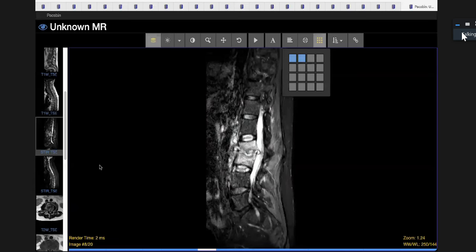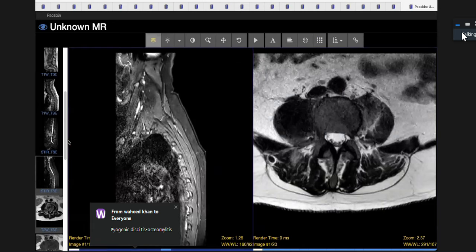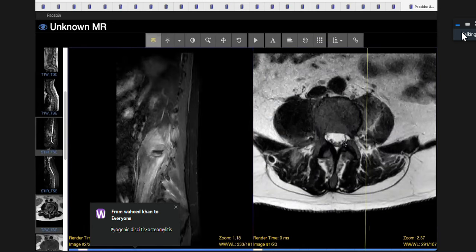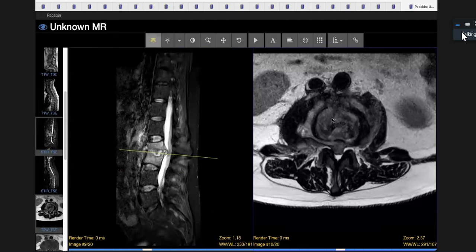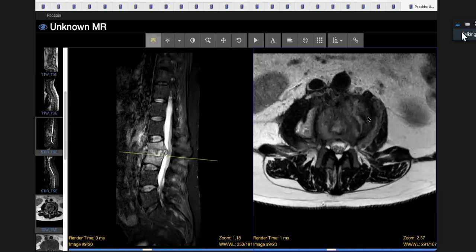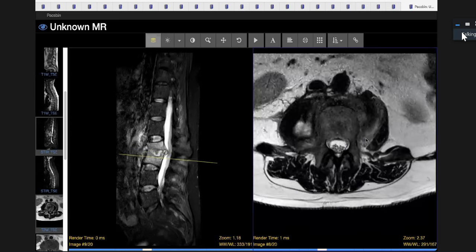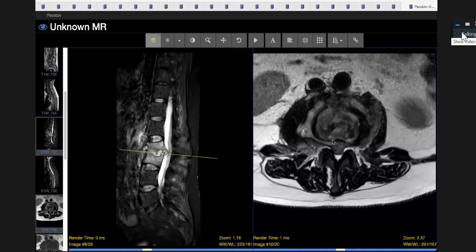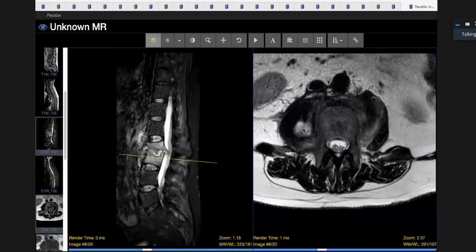That's okay. Yeah, go for it. So yes, the T2 axial images confirm the finding that there is extension to the adjacent psoas and prevertebral and epidural space, and also severe narrowing of the cauda equina. There is also narrowing and compression. So talk to me about the psoas muscles. So in the psoas muscle, I see T2 hyperintense, mixed hyperintense signal within the psoas muscle.